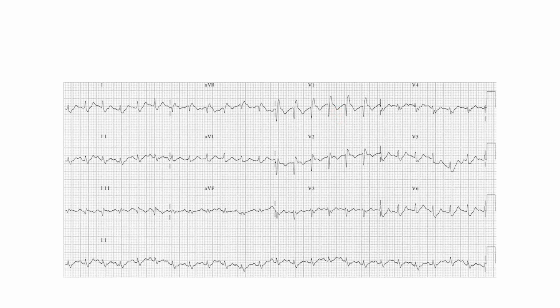And this one, I must say, even looks a bit like a Brugada type pattern. This is one where my gestalt would say I have to go check out whether or not that is true. But it also depends on the history. If it's transient loss of consciousness, then yeah. If it's just dyspnea, then I'll look at the inverted T waves all over here and go from there.